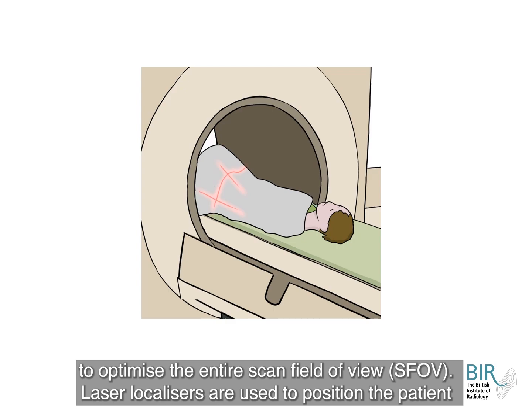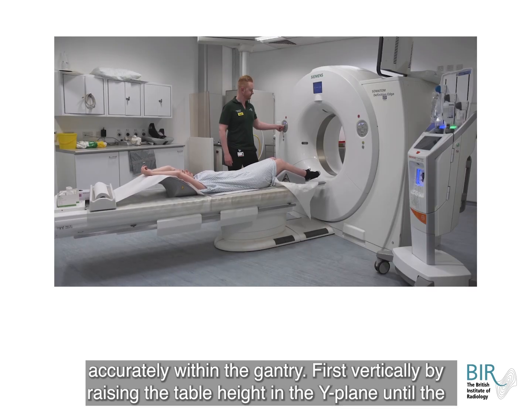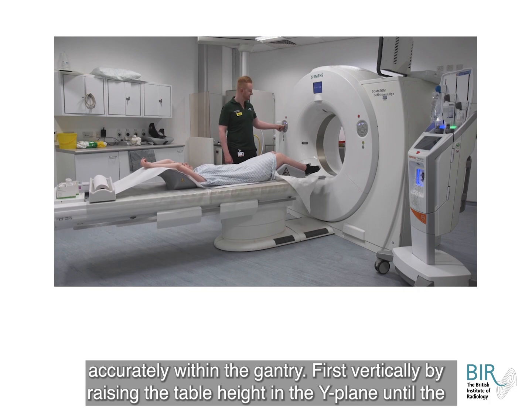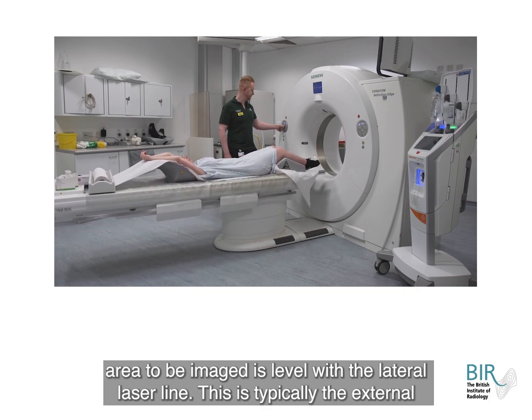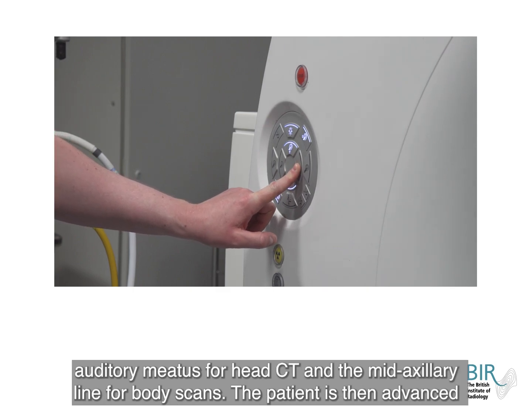Laser localizers are used to position the patient accurately within the gantry. First vertically, by raising the table height in the Y-plane until the area to be imaged is level with the lateral laser line. This is typically the external auditory meatus for head CT and the mid-axillary line for body scans.